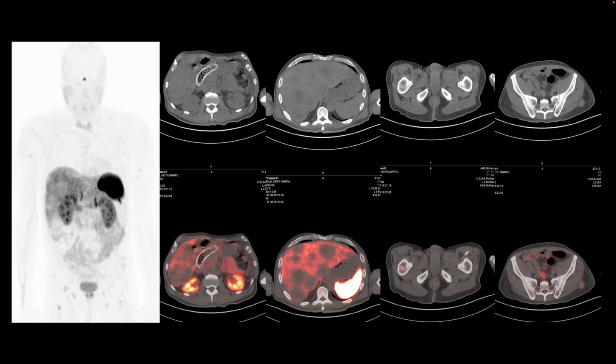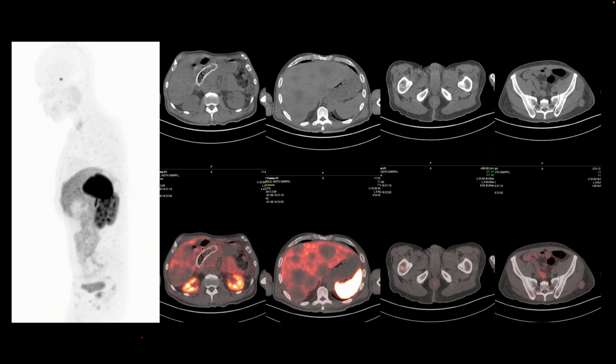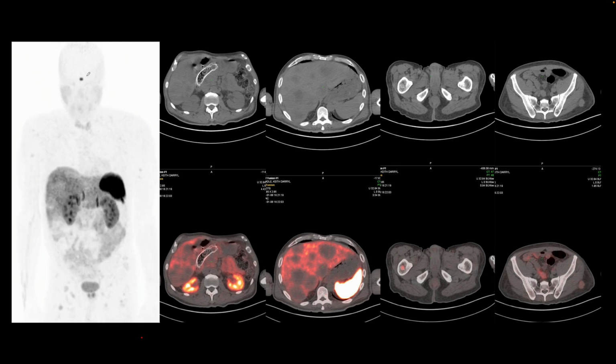Here's our next patient. This patient was diagnosed with a duodenal neuroendocrine tumor, and we performed a dotatate PET CT. Let's start by reviewing their rotating image. So we see physiologic uptake in the pituitary, which is characteristic of dotatate. Right there, we see intense uptake in the spleen compared to the liver. Liver is markedly enlarged, and here are some axial images showing a stent in the duodenum.